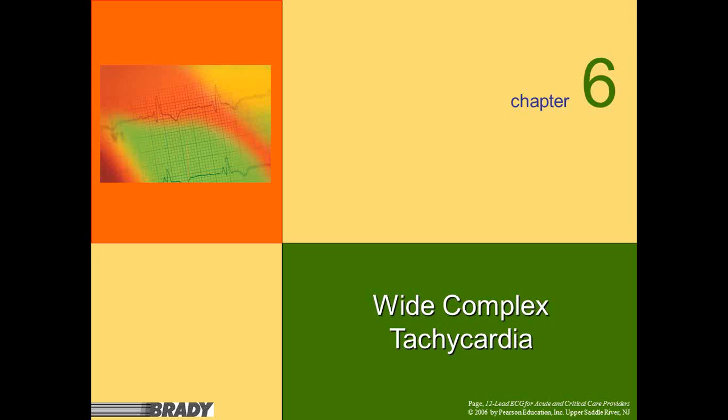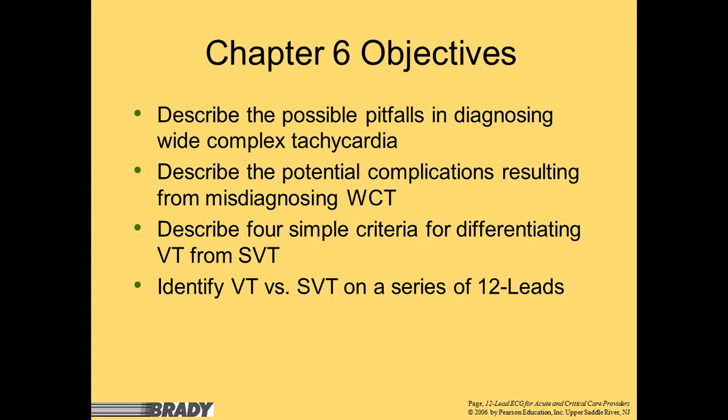Some of it is going to be doable in the field, some of it not so much. So we'll talk about wide complex tachycardia. I think you guys have been through ACLS enough to know what we might do for this, but we're going to talk about how this is going to look in a 12 lead because you're only seeing small segments.